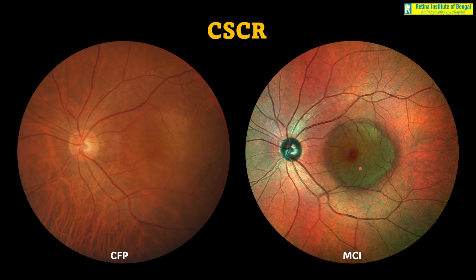Now, obviously, this is how we usually think CSR looks, but this is definitely not how CSR appears clinically. And you can see this clear demarcation, something greenish. It was very odd. But this was not the only time when we were surprised.